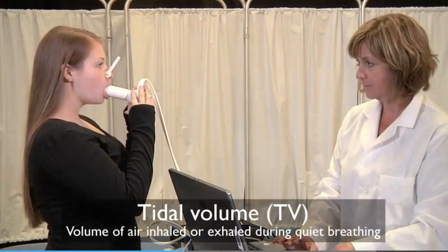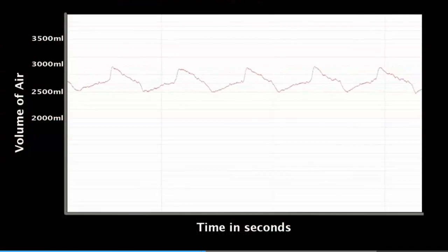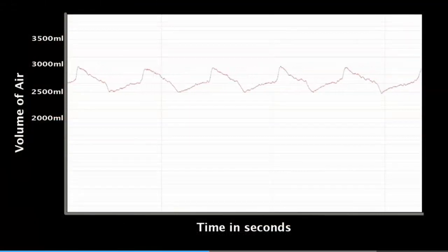The volume of air inhaled is the same as the volume of air exhaled. This volume is called the tidal volume, or TV, and is typically about 500 milliliters. To analyze the results, read the volume of air moved on the y-axis.